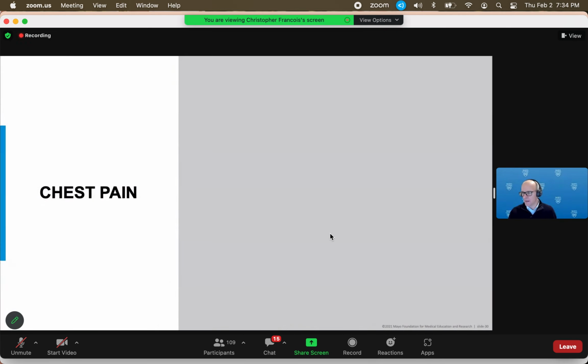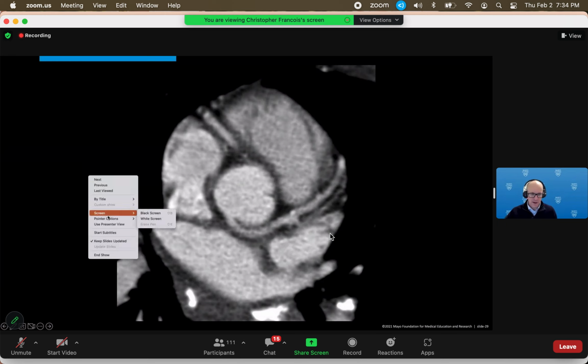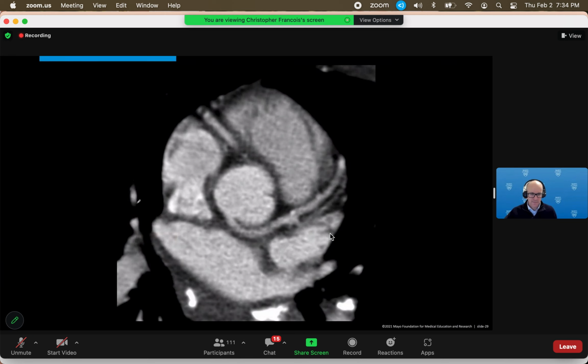Okay, who's up next? We've got a question from someone who asked, how can you decide if the artery is intramural or not? Oh, yeah. Let me go back one and get out my pen.